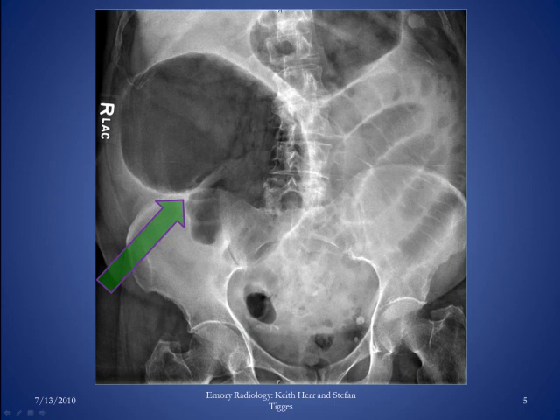In the following example, a large featureless loop of bowel is seen filling much of the right hemiabdomen. In this case, the larger convex portion points to the right upper quadrant. However, it appears to originate from the usual location of the cecum in the right lower quadrant.